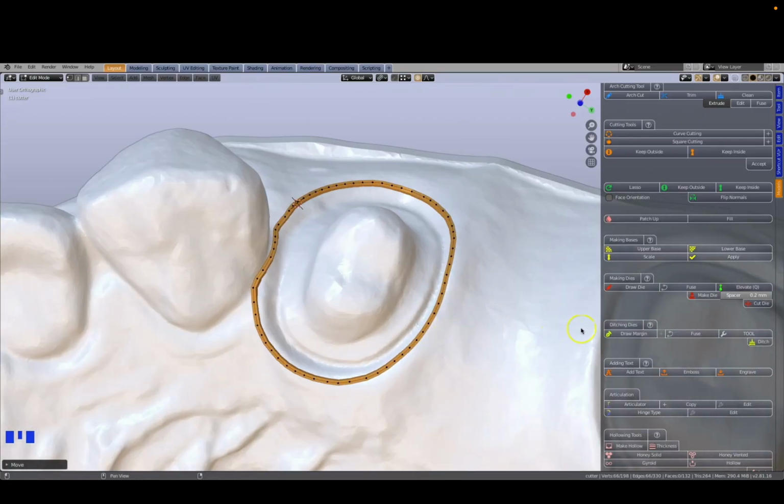Navigate to the menu, and either use the slider bar, or type in a value for the required offset. The offset is a small clearance or space which is required between the model and the die to ensure the die fits snugly into the model. This offset depends on your own printer settings and the properties of your printing resin. You will need to conduct some of your own testing to make sure the dies fit perfectly. For this demonstration, we will use 0.2 mm.